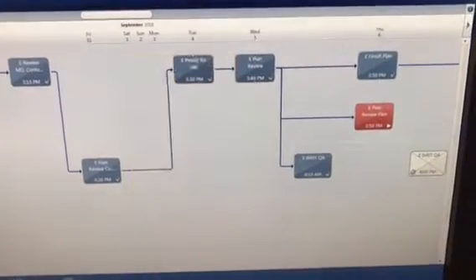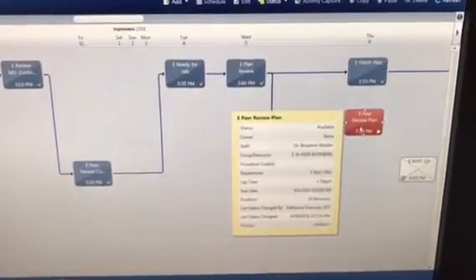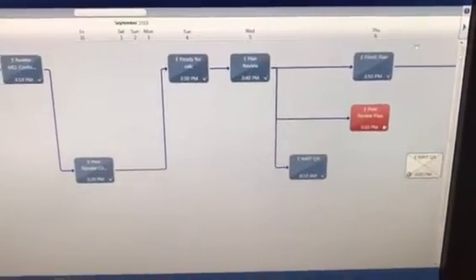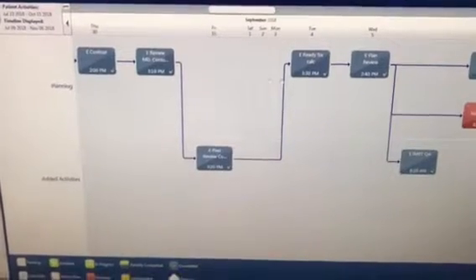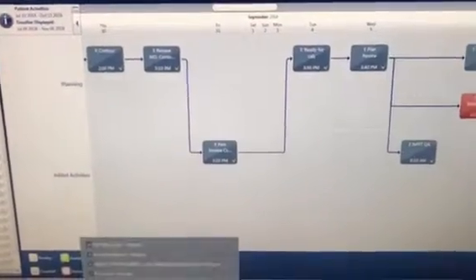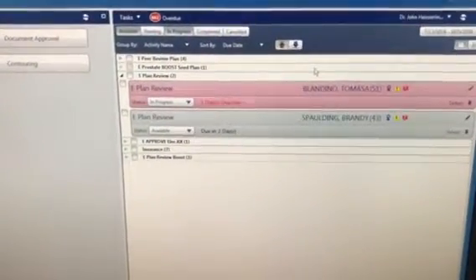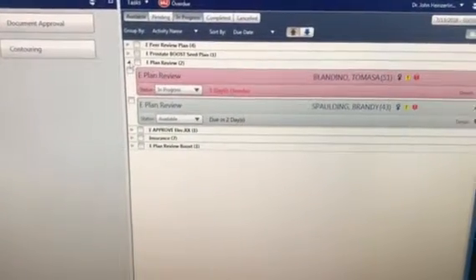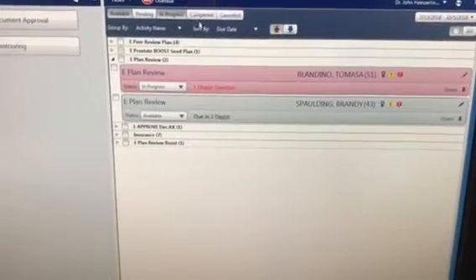That will generate tasks for the dosimetrist to print it. The peer review task will be dropped. The QA task for physics will be dropped. And what this does, it may not look like it increases efficiency for physicians, but the biggest thing it does is generate tasks in this window within ARIA that really allow for launching of tasks automatically.